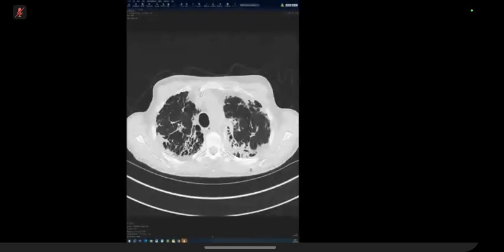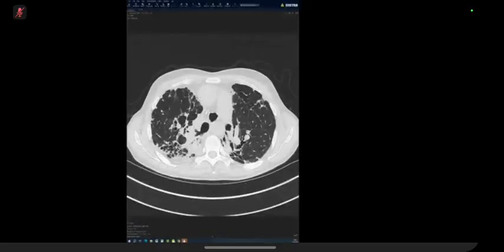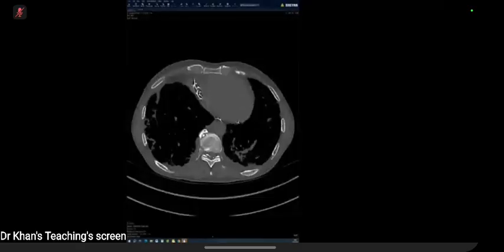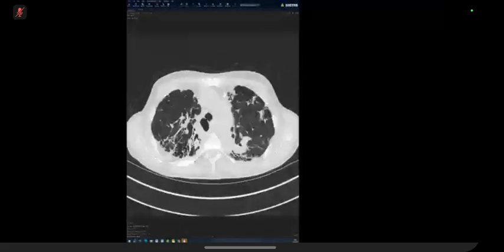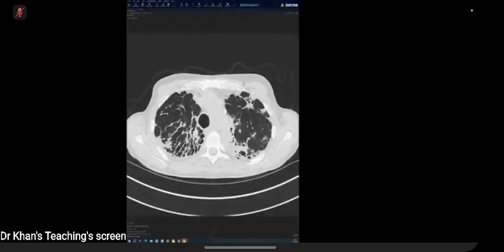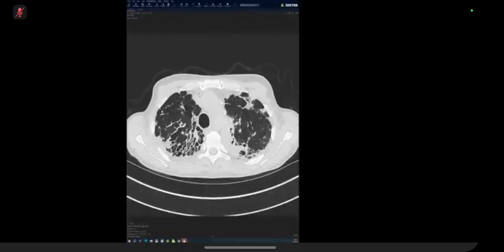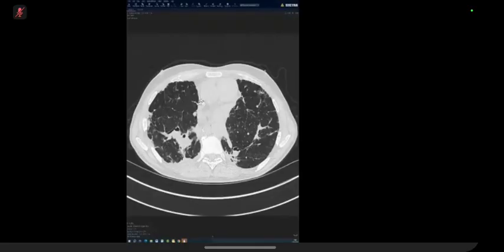So you have a pattern of fibrosis that's quite typical for a disease. This is a posterior pulling of the bronchi. It's almost like somebody standing behind the patient and pulling the lung backwards. It's very typical for stage 4 sarcoidosis. And by stage 4, lymphadenopathy has usually resolved and you have a bit of calcification left. But the pattern of fibrosis, the posterior one, is quite typical for sarcoid. And if you see that, the expectation would be to think down the sarcoidosis route pretty quickly. And then the next question will be, what stage of sarcoidosis is this? Do you know the stages of sarcoidosis? Can you tell me the stages, which I'm sure you do.